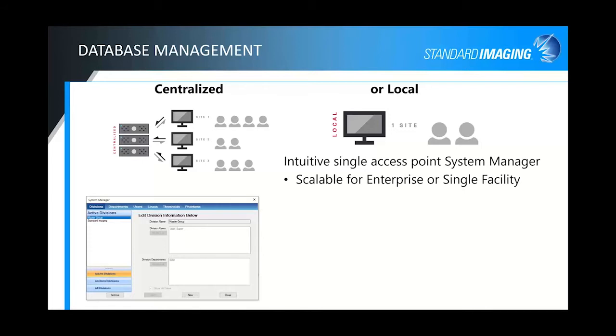LINACs, self-explanatory, where you put your LINAC information in for the specific LINACs of your facility. The thresholds, which I'll touch on in a second. Phantoms as well. We've got a couple of different phantoms, 3 different phantoms for PIPSpro. Some of the tests are phantomless, but our phantoms are calibrated at the factory, and you get those calibration function numbers included with the phantom that can be input into the software as well.